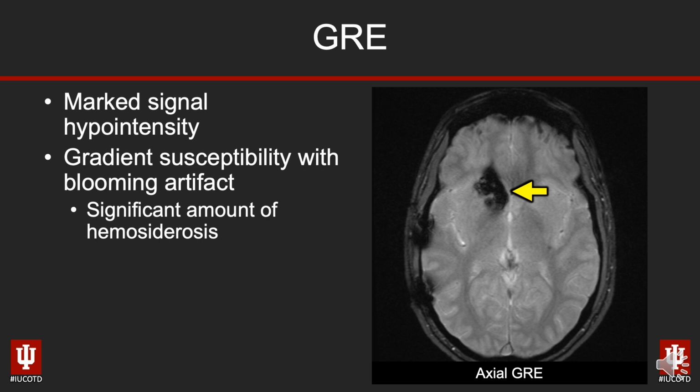You also note that we see that susceptibility effect along the right parietal craniotomy much better on this sequence as well.